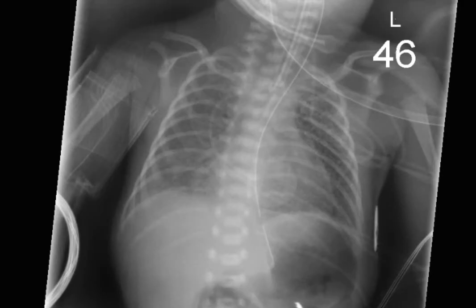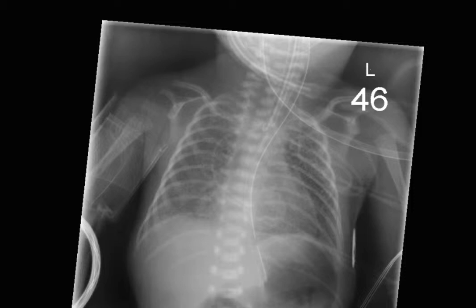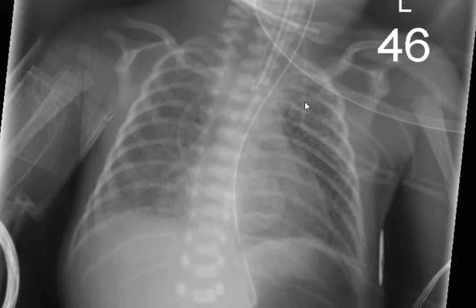There's a different patient that has very localized interstitial emphysema. Interstitial emphysema, even if it's subtle, is not difficult to diagnose when it's asymmetric, as in the previous case as well as this case. If you'll notice, there just appear to be small bubbles in the mid portion of the left lung. I don't know if they're in the upper lobe or the lower lobe, probably the upper lobe. And I don't see the same lucencies in the same part of the contralateral lung. So this is very early asymmetric interstitial emphysema.